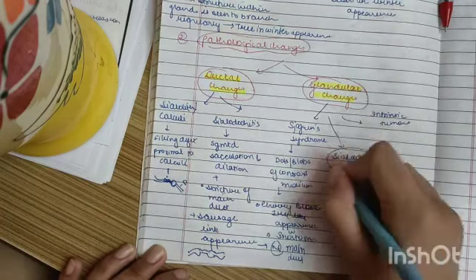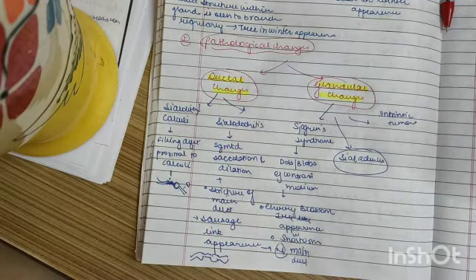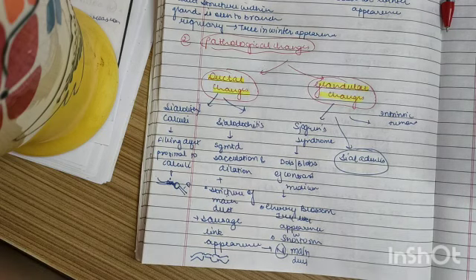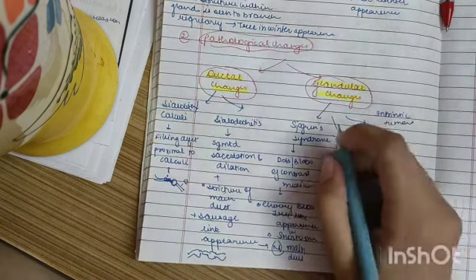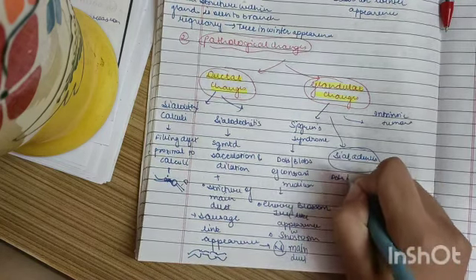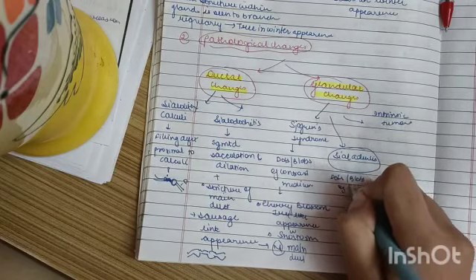Now coming on to sialadenitis. This also comes as a short note. There are different types of sialadenitis: bacterial, viral, fungal also. We'll talk about it in the video on sialadenitis alone. Over here also what you will see is dots and blobs of contrast medium.